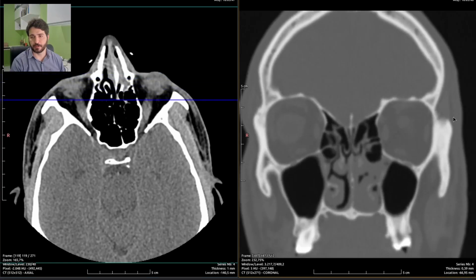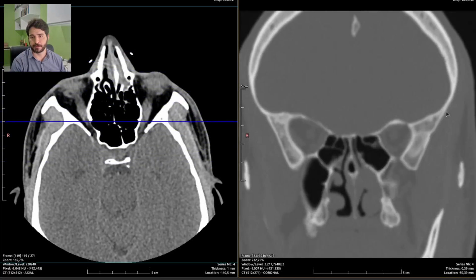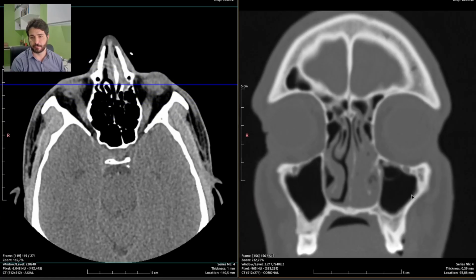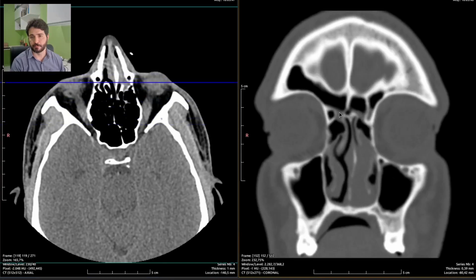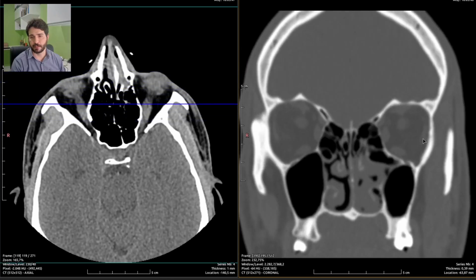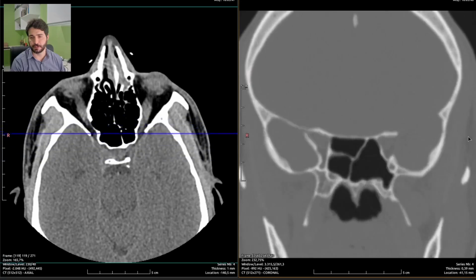So there is anomalous content and thickening of the mucosal layer of the nasal cavities and the paranasal sinus, especially the maxillary sinus. See? This is thickening of the mucosa. Frontal sinus are also affected. The ethmoid cells are also partially filled with anomalous content.